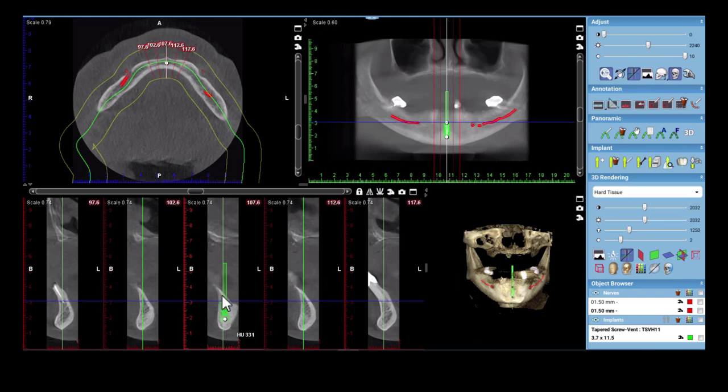So you can see there, we're going to take away a decent amount of height, and we could potentially bring it up maybe here, but any more than that, what I've found is you end up with bone loss on the buccal here. So I really would rather do a little more bone reduction and then have a substantial amount of buccal bone rather than have those exposed threads anterior, on the facial of the implant.